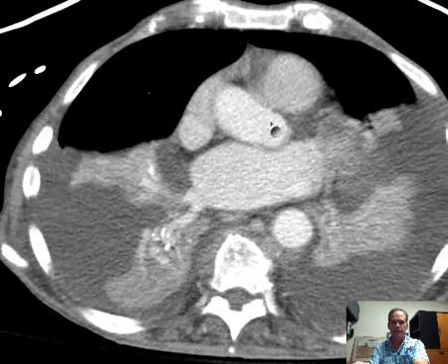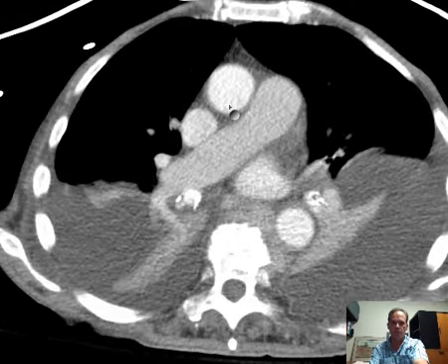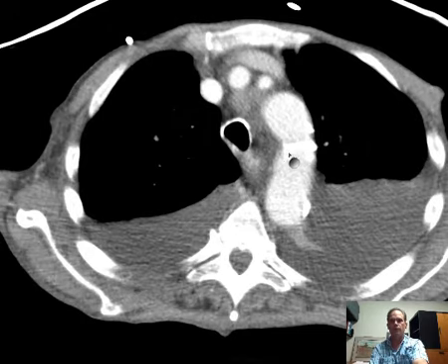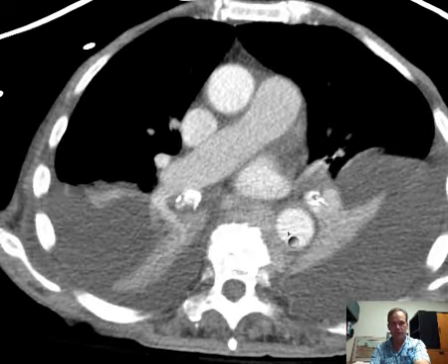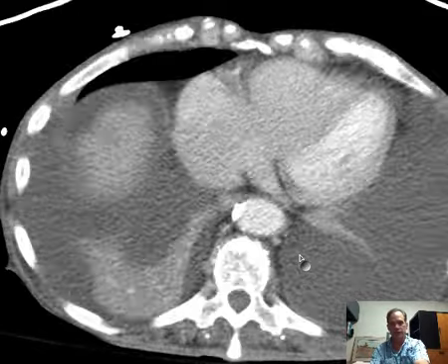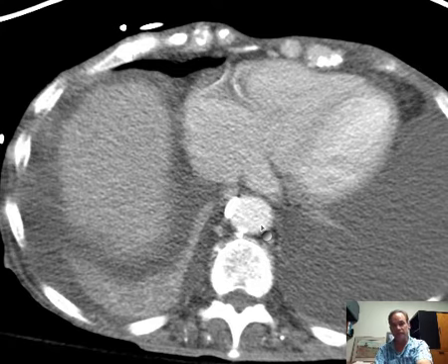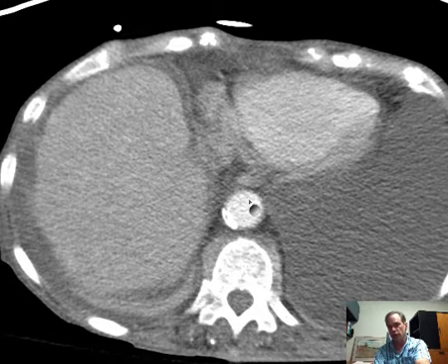So let's start out by saying what we have first is the aorta coming out of the heart, arching up and backwards like this as the aortic arch, and then descending as the descending thoracic aorta, all the way down like that till it gets to the diaphragm, and it goes through a hole, a defect, an opening in the diaphragm called the diaphragmatic hiatus. I'm sorry, the aortic hiatus. The aortic hiatus is the point at which the aorta goes from intrathoracic to intra-abdominal.